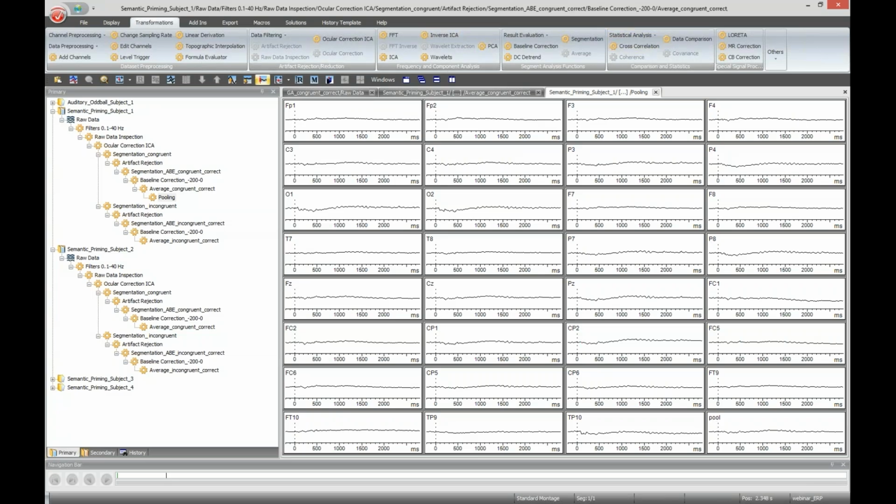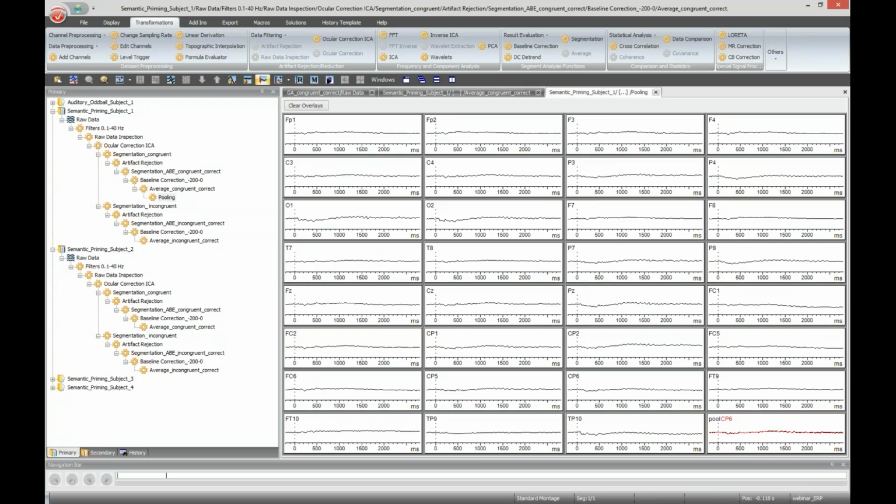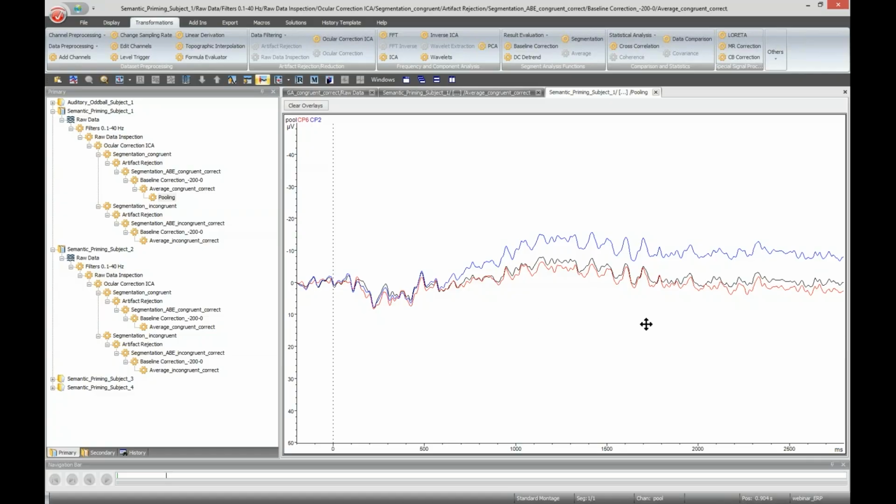And now what you can do is that you just drag a channel onto the other one like this and like this, and then you make it bigger, and then you can see it. Maybe this is what you wanted to know. If not, please send us an email later, then we are happy to check it for you. I think though this might be what you asked. Okay.